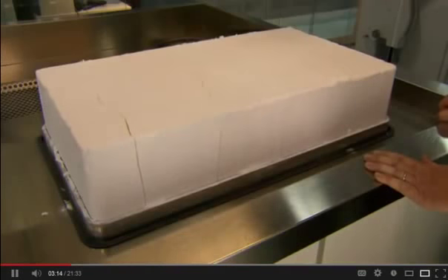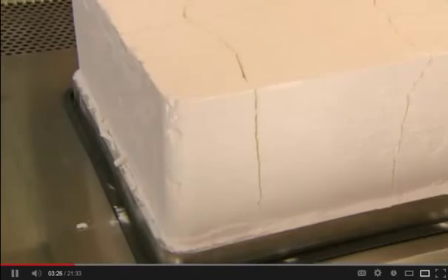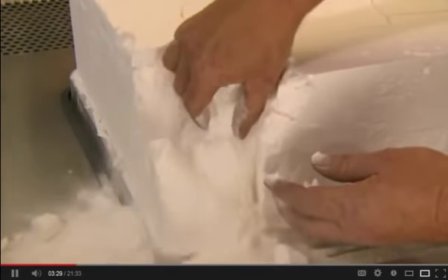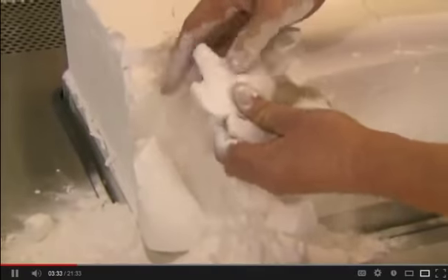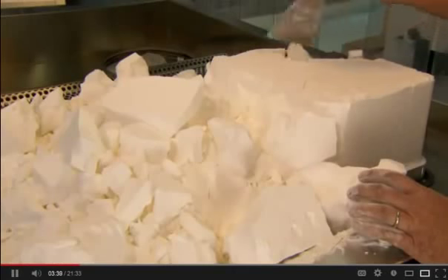One printer run produces personalized templates for up to 50 patients at a time. So the laser inscribes the patient's name and identification code on each part. Once the printing's done, it's just a matter of breaking up the unsolidified powdered plastic and fishing out the templates.